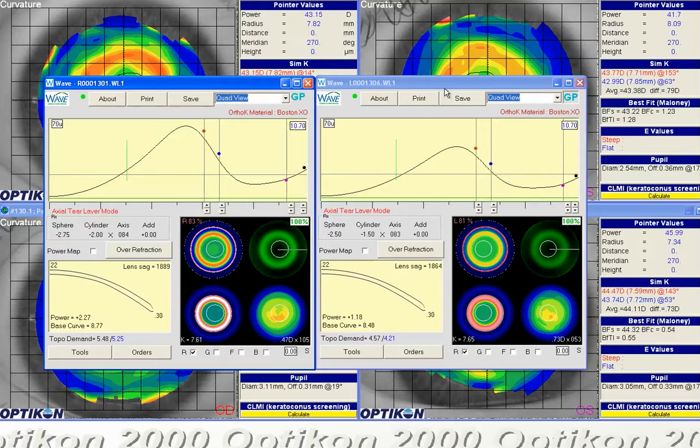As far as molding with the rule astigmatism into the cornea to kind of counteract what is behind the cornea, I guess theoretically you could go to an oval optic zone in the horizontal meridian, and then if we have a diopter or so of astigmatism, then we want the differential between the two powers to be a diopter. So for plus 1.18 right now, let me bump that. I think we were a little bit under minus. I'm going to pause the video and see what the correction was.